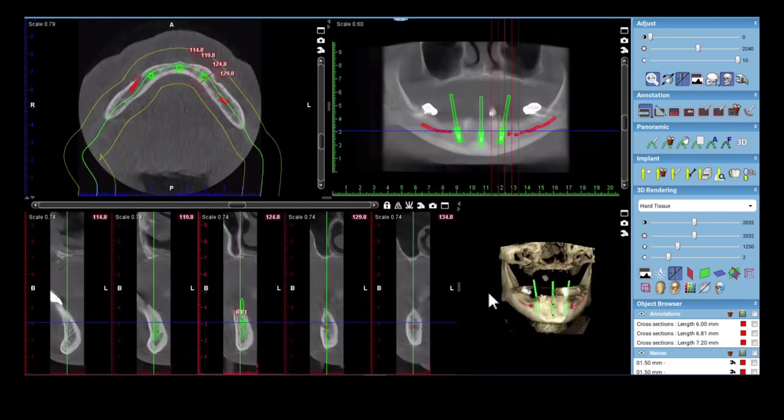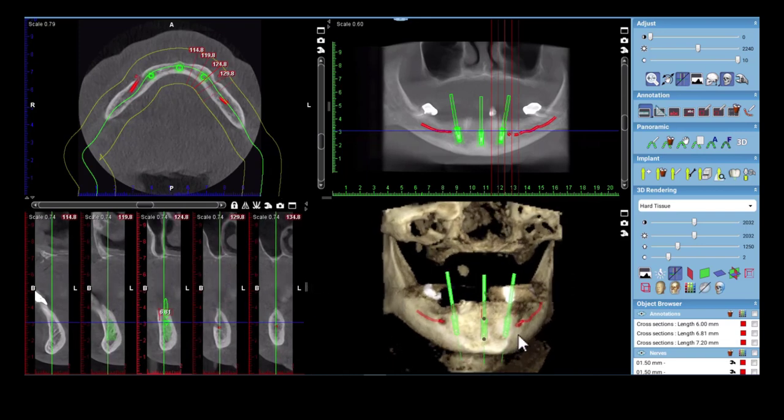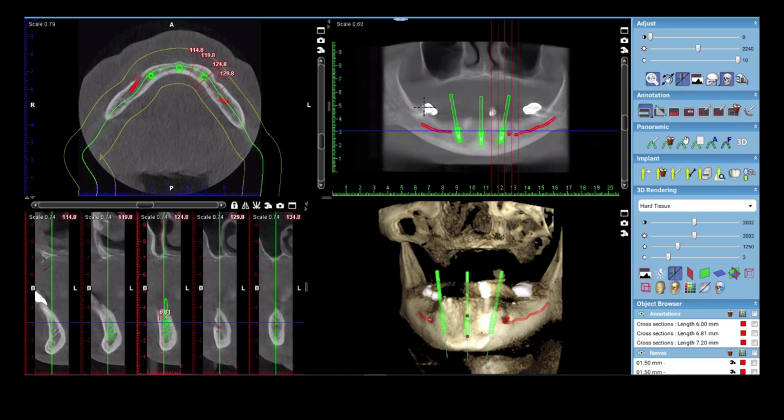I will take a screenshot and draw out on my iPad the sizes of the implants that we plan to use, as well as the reduction that will be done at the time of surgery. So on surgery day, we'll remove these remaining teeth, remove the molars, reshape the mandible so that we have plenty of width for these implants. We'll place the 3 implants, place cover screws, and then this patient will have a transitional or temporary denture that he will wear for a few months until we do the second stage surgery, and then we fabricate his bar for his overdenture.